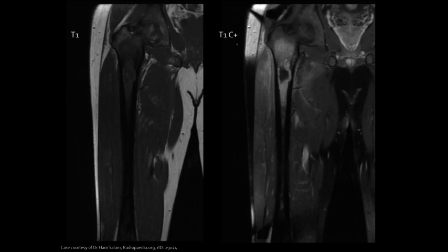Pre-contrast and post-contrast, we can see where there's more loss of the normal marrow signal. So marrow signal should be closer to what's up here. We don't really have too much of it though, and we're cutting into the more cortical region, so we don't see a great analog for marrow. But it should be brighter. It should be closer to subcutaneous fat, which in this case we can clearly see it's not.